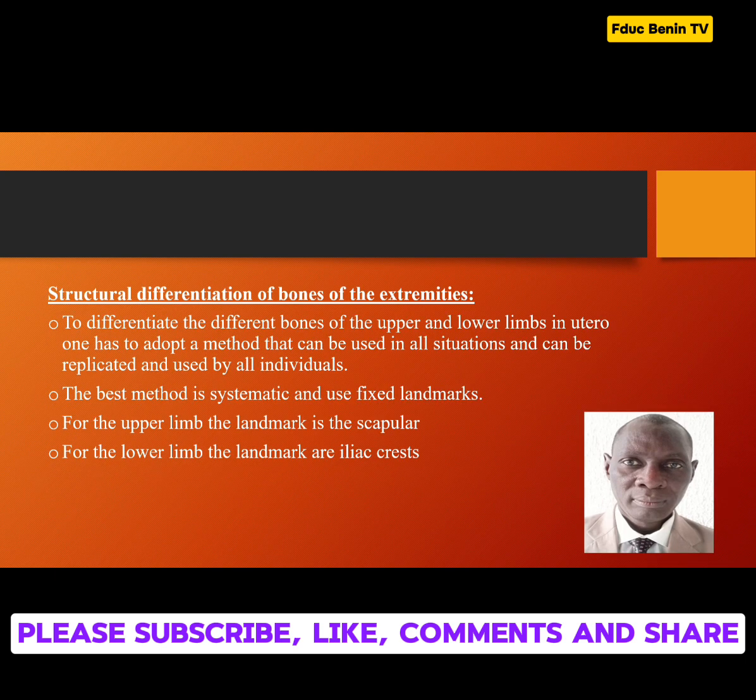Now let's look at structural differentiation of bones of the extremities. To differentiate the different bones of the upper and lower extremities in utero, one has to adopt a method that can be used in all situations and can be replicated and used by all individuals. This, I think, is the best approach, systematically going through all the limbs. Now, the best method, like I said, is systematic. And this must be complemented using fixed landmarks, because the landmarks will serve as the starting point. For the upper limb, the landmark is the scapula. And for the lower limbs, the landmarks are the iliac crests.